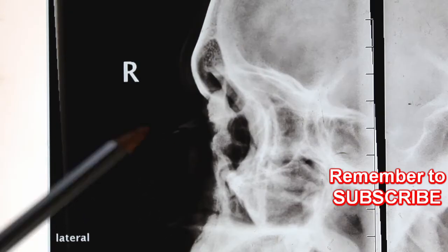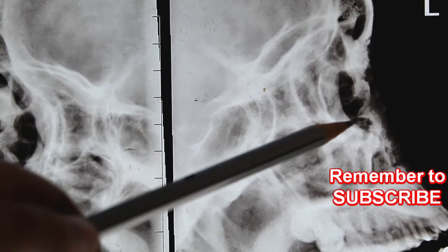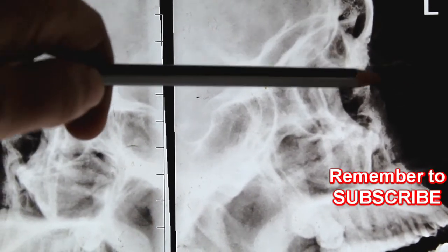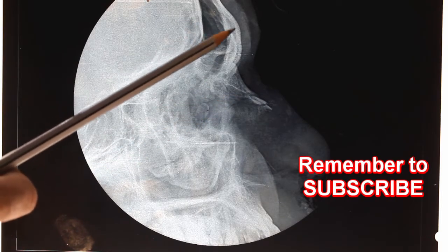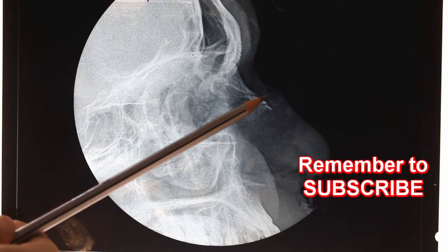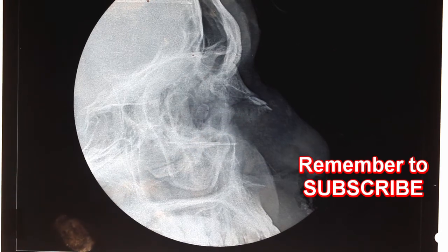Okay, fracture nasal bone. And you can see that here also this is a nasal bone with a fracture at the tip of the nasal bone. In this you can see that very clearly. X-ray nasal bone lateral view. This is the X-ray nasal bone showing fracture. Two fracture lines are there, 1 and 2. Okay, it's very clear here.